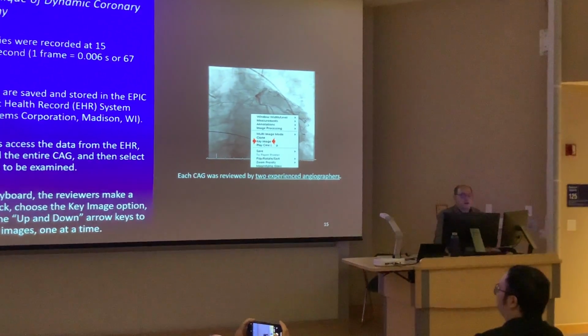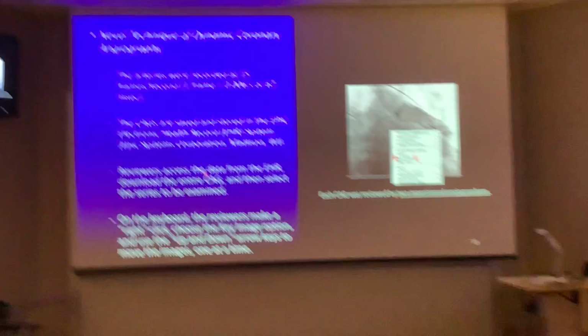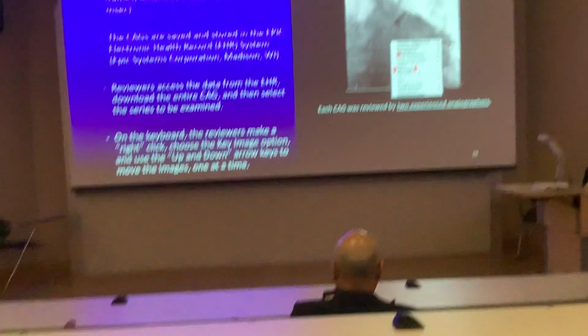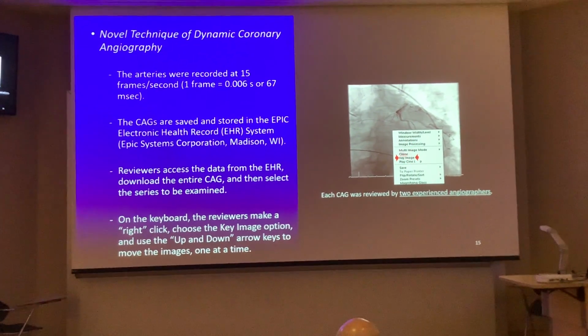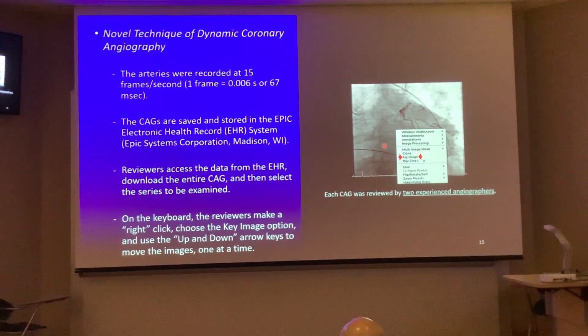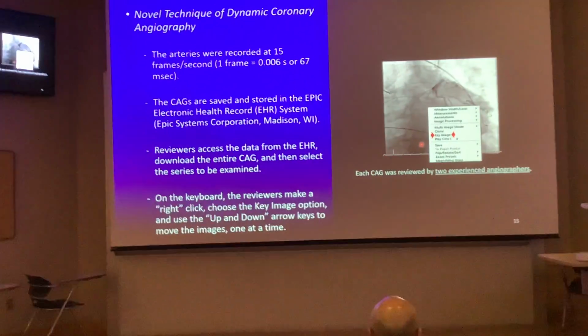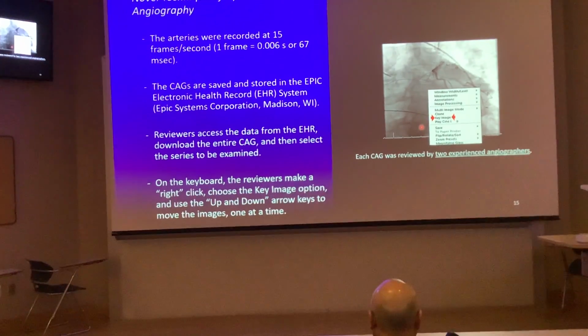They were stored in the EPIC system, where the reviewers could access them and examine them. Using the key image system on the computer, you could select key image and use the up-down arrows and review each frame of the angiogram separately to observe the flow dynamics.